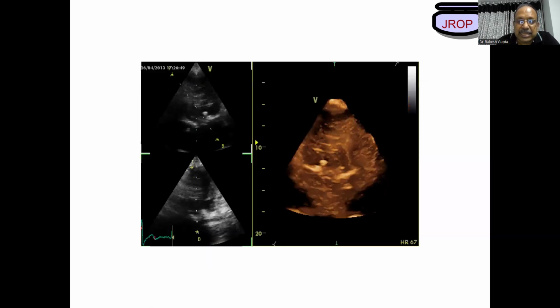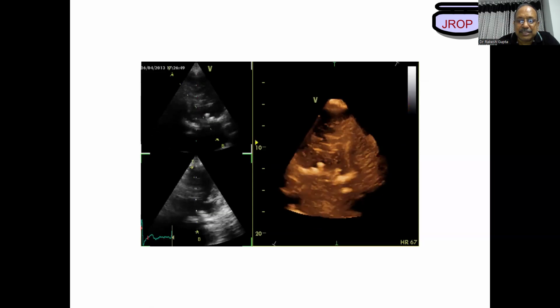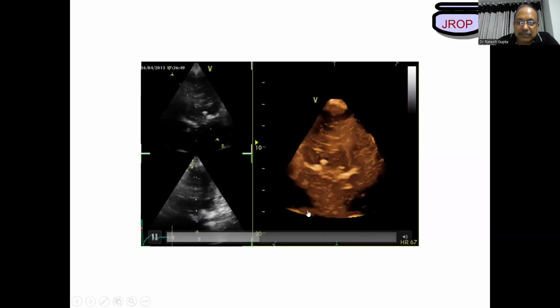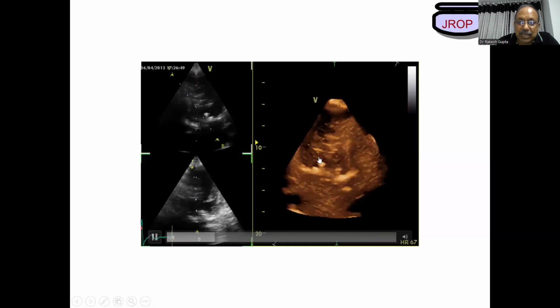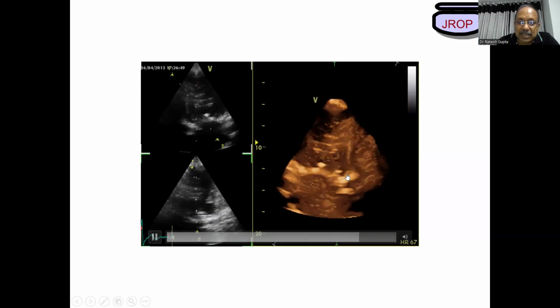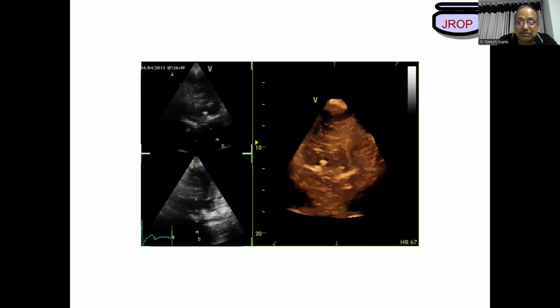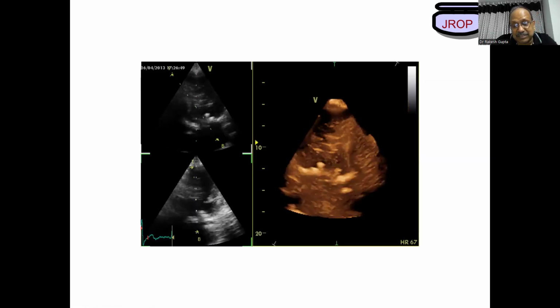The best answer is you can get it in 3 dimensional echo. Look, there is no reverberation behind. If it's metallic, reverberation would be there. Only the studs are there. And when these are stentless valves, believe my words, it becomes very difficult to identify those valves.